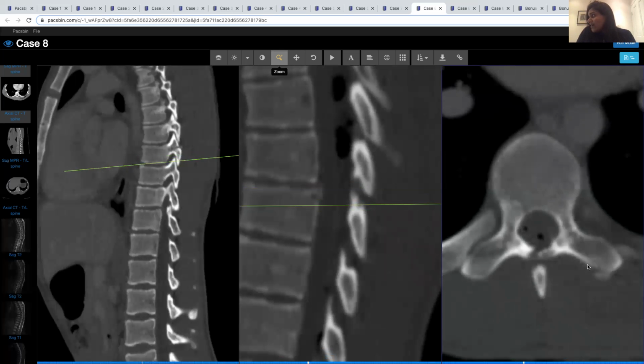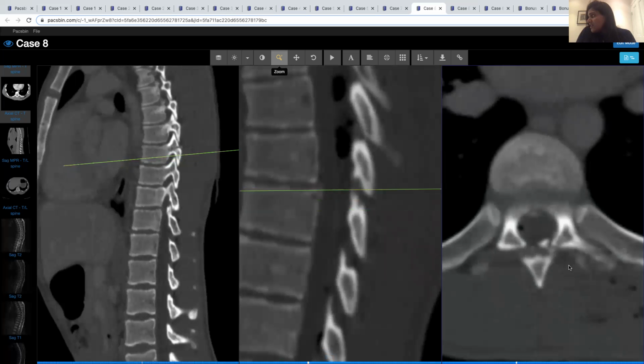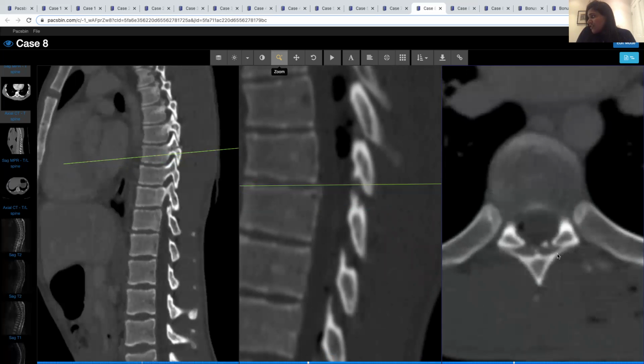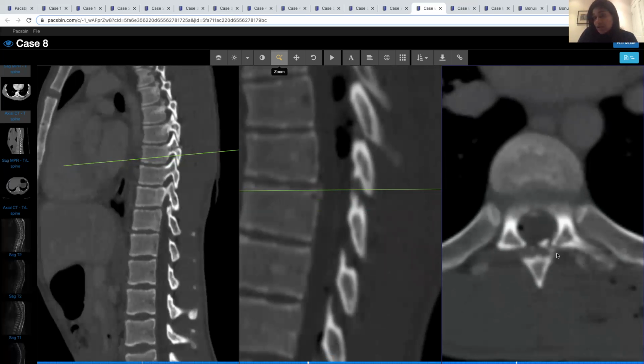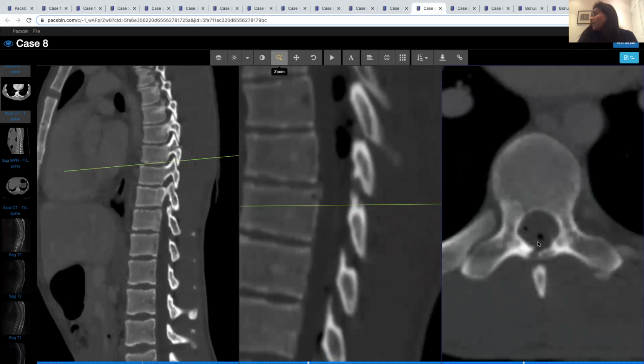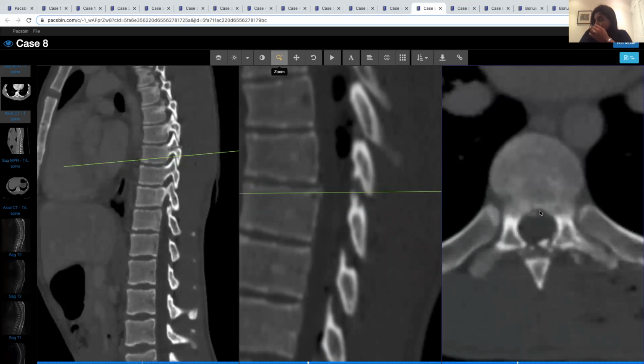And when we look on the axial images, we can also see that there is a bony fracture. Well, it'll be a penetrating injury fracture as a result of this stabbing, and this is going through the lamina at this level. You can see that retropulsion of that bit of lamina, bit of bone. There's gas within the vertebral canal.